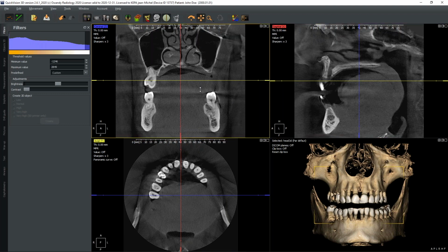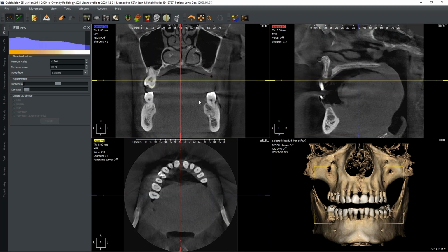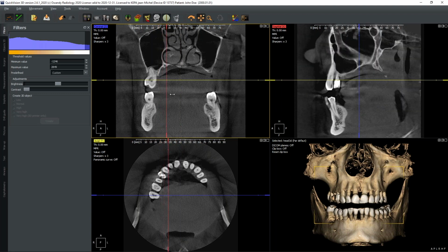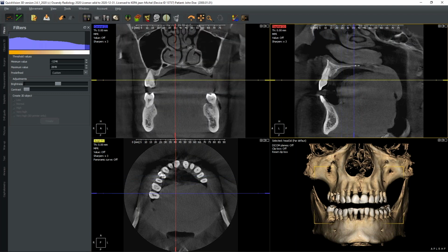When we take the line, we're able to move inside the volume. And the color of this line, for example the red line, I read on the sagittal view. If I move the blue line, I read the coronal view. I'll show you how it works.